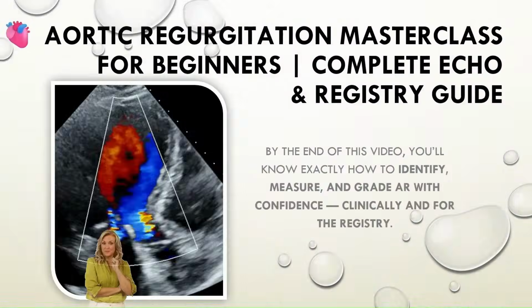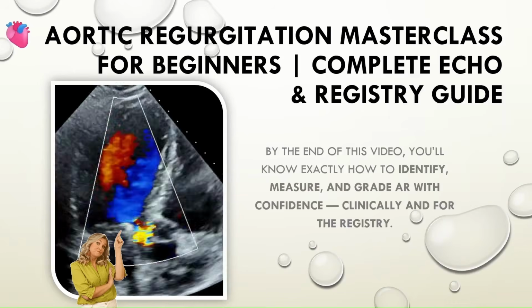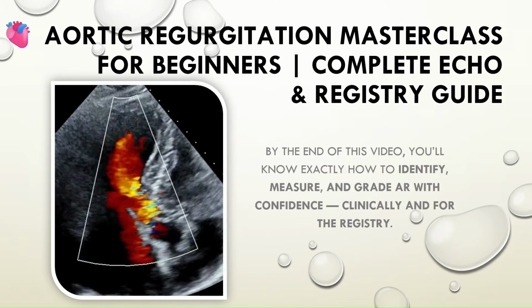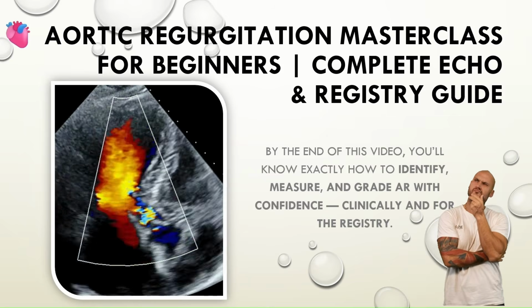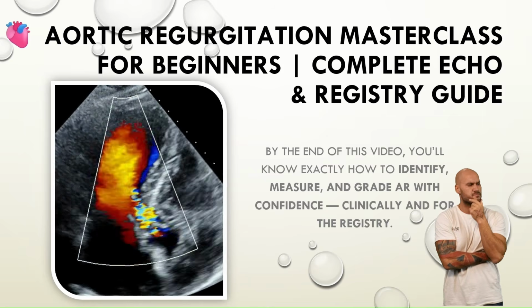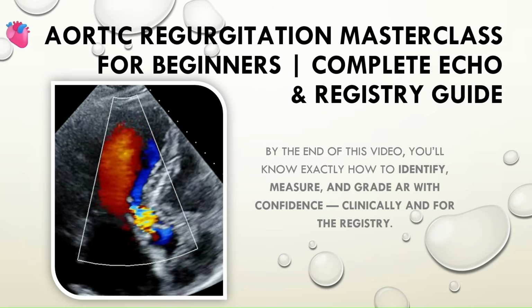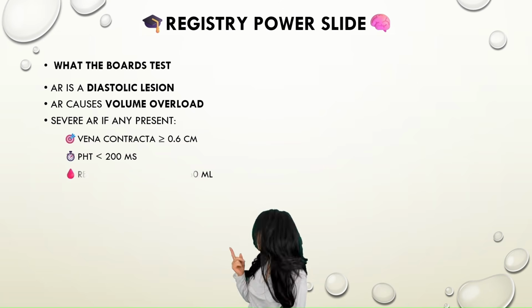Today we're going to be talking about aortic insufficiency. This is a complete aortic regurgitation masterclass designed for beginners. We'll build everything step by step, all the way to registry level measurements. By the end of this video, you'll know exactly how to identify, measure, and grade aortic regurgitation with confidence, clinically and for the registry.